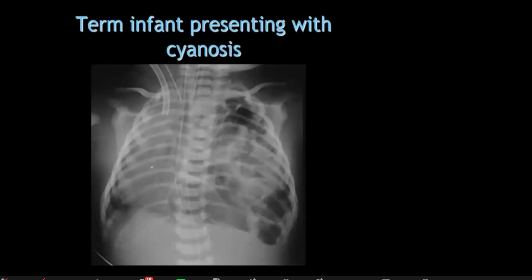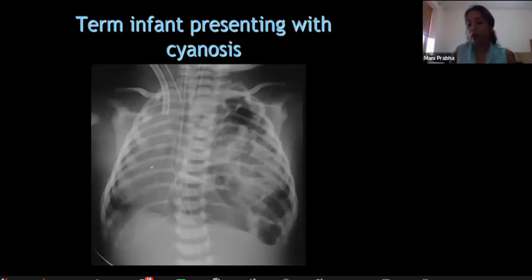So I think I can see mucosa around the air bubbles on the left, but with other multicystic lesions in the lung, it could be a CPAM, congenital pulmonary airway malformation. Yes, you should always keep that differential.